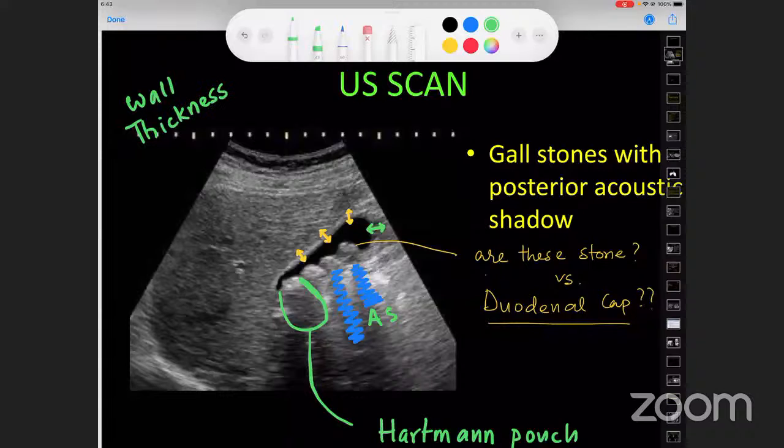So think about it, guys: if you have a sac which is uniformly inflamed, that inflammation should be universal. You would have the same sort of thickening on the liver aspect and on the serosal aspect, because the whole gallbladder is a single cavity. But woe betide if you find that one wall is thinner and the other wall is thicker, because immediately you start thinking, could this be something else? Could this be slightly more sinister? And when we talk of sinister, we are talking of either a neoplastic lesion or even xanthogranulomatous cholecystitis. So that's my second issue.